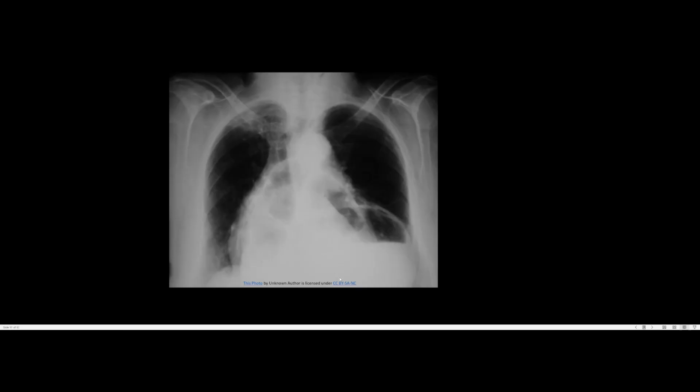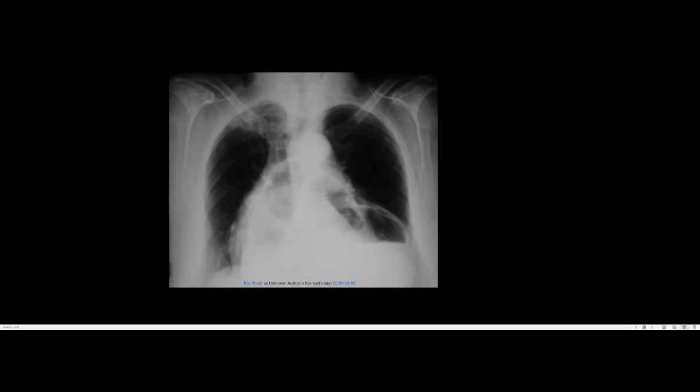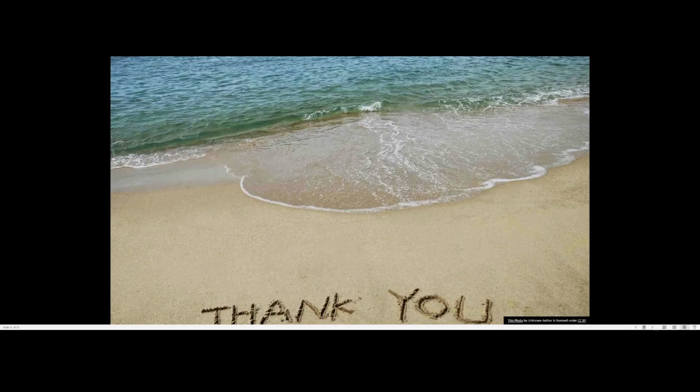Again, this is showing hiatus hernia. You can see an air fluid level within the area of the heart. So this patient has hiatus hernia. Remember, X-ray shows a lot of overlapping structures, which will show completely different appearances from what you think. So you need to think logically. That's pretty much it for hiatus hernia.